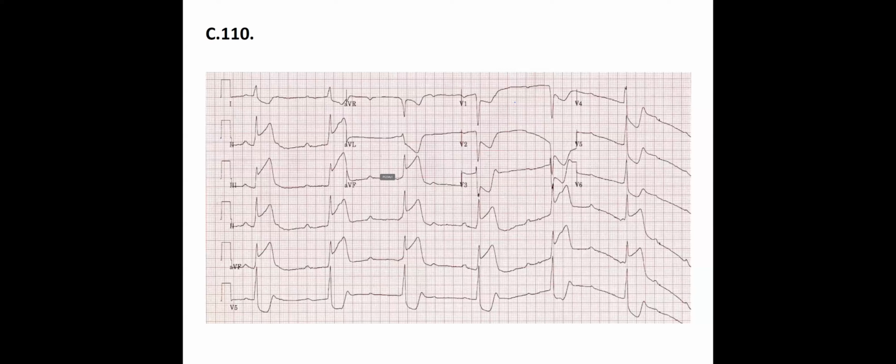All right. So I had this one. I said that it is rhythmic and that the heart rate is around 40 beats per minute, and that the axis is normal. And since the distance between the P waves changes and there are some unconducted P waves as well, I think it's third degree. Only one unconducted beat? No, there are more. None of the P are conducted. This is why you said third degree. Right. Sorry. So yes.